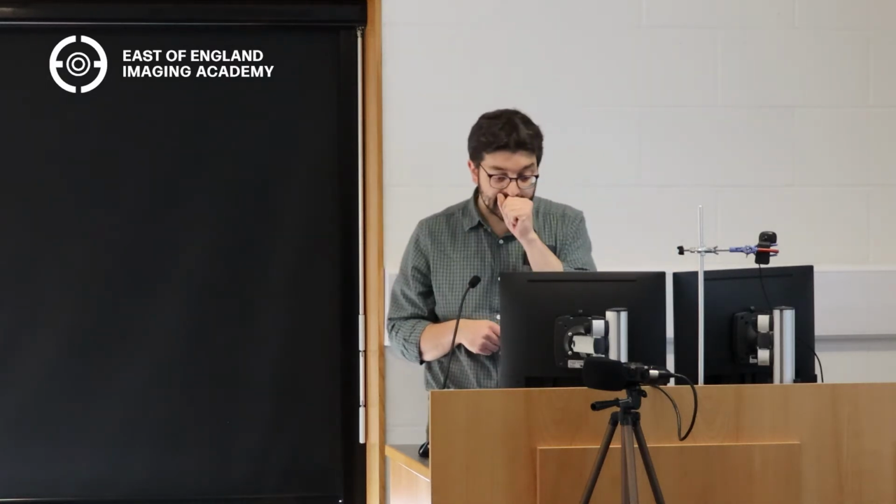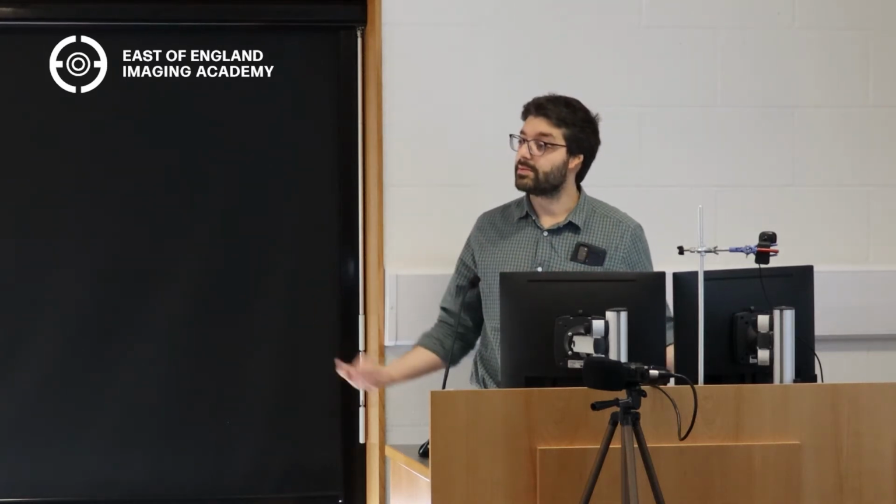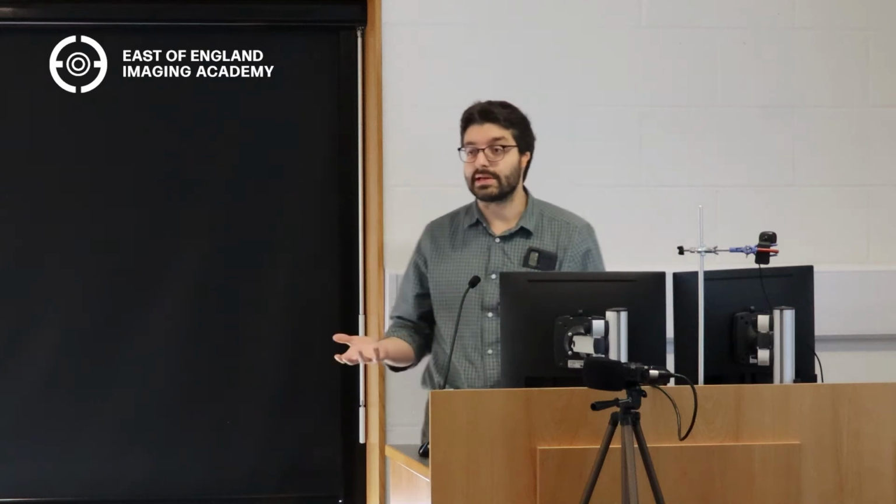Okay, you wait a very short period of time for that. But if you're interested in the abdomen, that's a very useless phase for looking at the abdomen. So what do we do? We wait longer. What's the contrast going to do next? It's going to go into the pulmonary veins, into the left side of the heart, and then from there it's going to go into the aorta. So if you're doing an angiogram, looking at the aorta for a triple A or something like that, that's when you do your scan. Does that make sense?